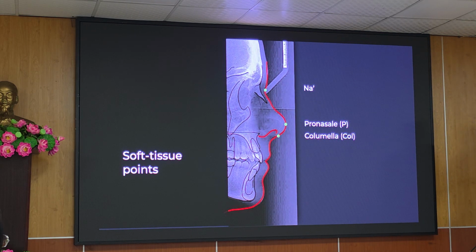Đó là cái bờ dưới của mũi, từ cái đỉnh mũi tới cái chỗ mà góc mũi á, tức là tới cái chỗ mà bắt đầu của môi. Cái đoạn đó chúng ta chia đôi ra thì cái điểm đó là cái điểm columella. Vì cái cấu trúc từ đỉnh mũi tới chỗ cái chân mũi, tức là chỗ bắt đầu của môi á, cái cấu trúc đó người ta gọi là trụ mũi, mà tiếng Anh nó gọi là columella. Trụ á thì column là trụ đó, cho nên thì cái điểm đó là columella, viết tắt là COL.